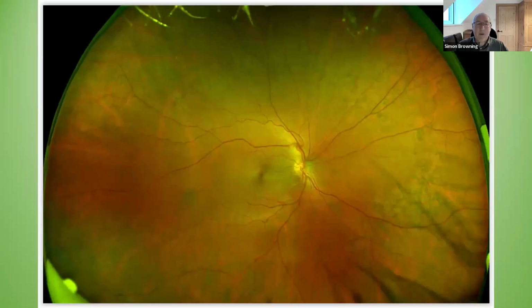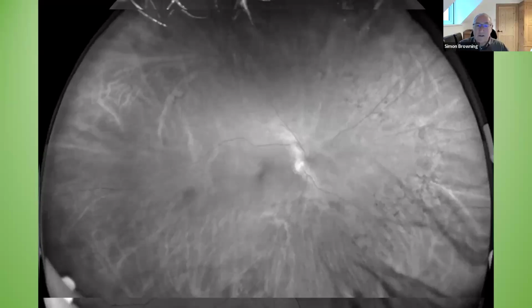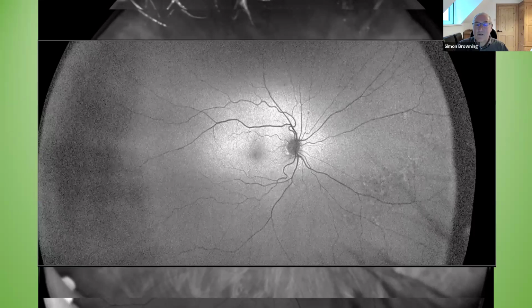And this is the classic sort of honeycomb degeneration, the change in pigment in the periphery here, which when you look at the surface of the retina tends to look mottled, but when you look at the red channel down at the RPE level, you can see these very specific shapes, the polygonal shapes of the pigment agglomerations here. And so this is the sort of thing to look for. And then on autofluorescence, the classic lace-like pattern to the periphery there. Just do remember this vascular anomaly.